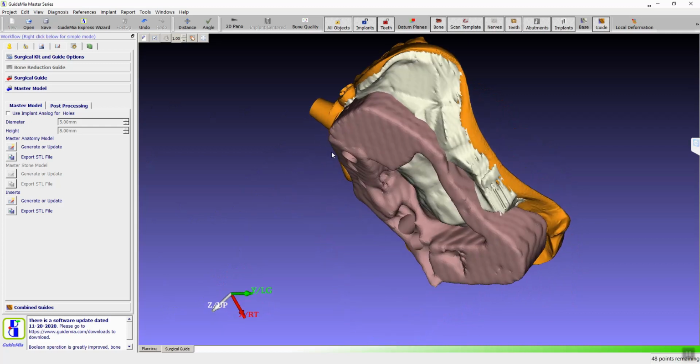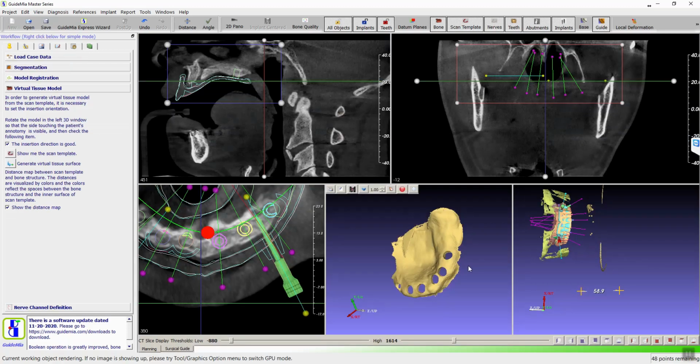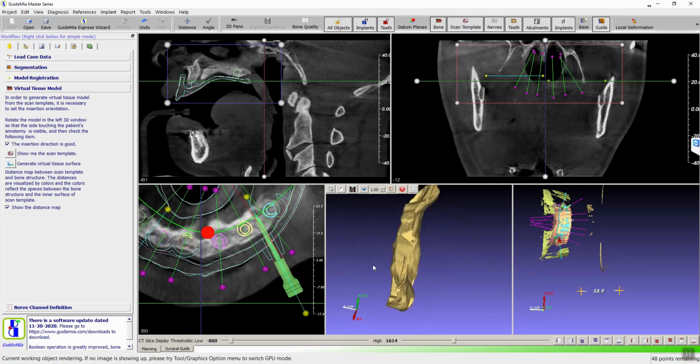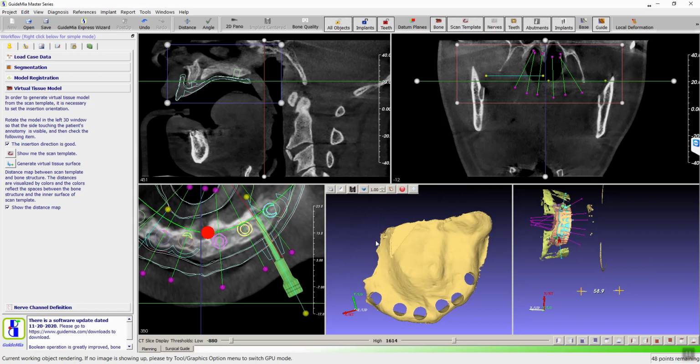Here we generated that, but it takes this model. It actually has a tissue part as a reference, so this piece is gone. Maybe not the best example to do what we were doing. But still we have this one, right? This looks nice, just that piece because of the model.